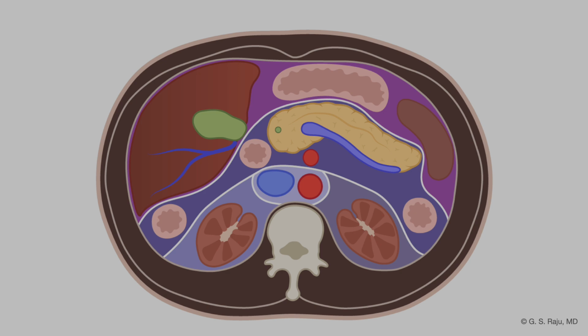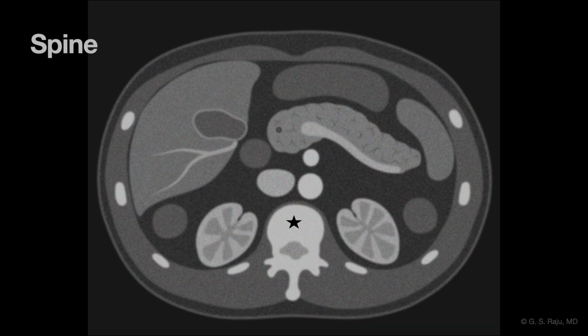This section. How do I teach my fellows? So we start with the spine. Here is the spine. Easy to identify the spine. And on CT, you can easily find the spine.